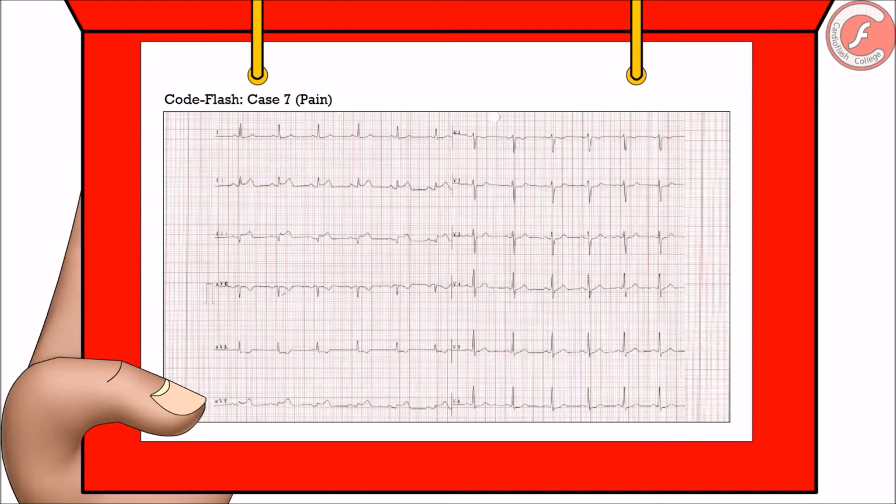This is the electrocardiogram of our patient. As you can see, it is evident there are changes in the ventricular repolarization. These alterations express as elevations or descents of the ST segment in some leads, and they suggest an acute myocardial lesion. Could you identify these disturbances?